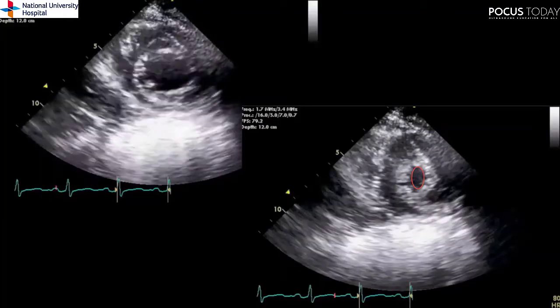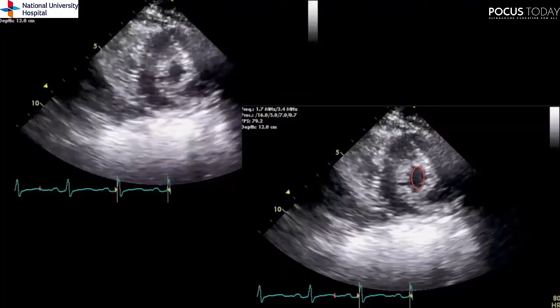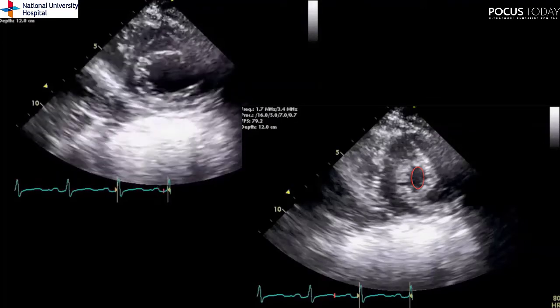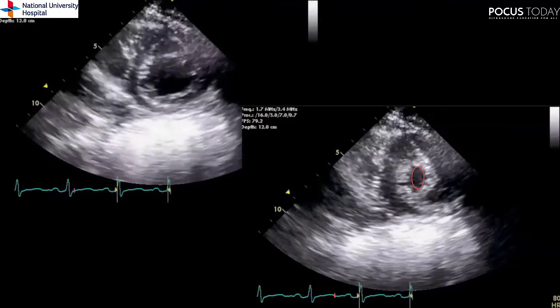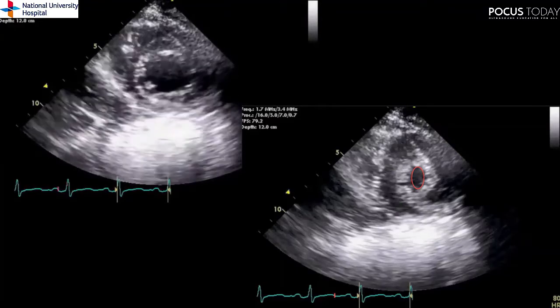Here is an example of an LV in a patient with hypovolemia. In hypovolemia, both the end diastolic and end systolic volumes are reduced. The ventricle has the appearance of a kissing ventricle at end systole. This is in contrast to low afterload where the end diastolic volume is normal. Note the small size of the end systolic LV cavity in the image on the right.